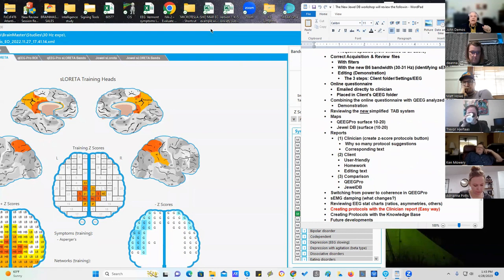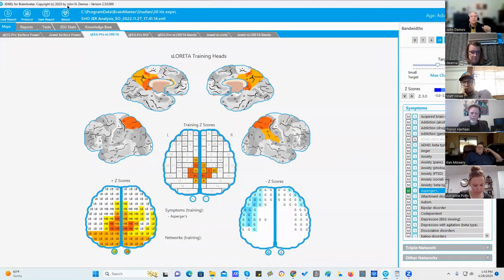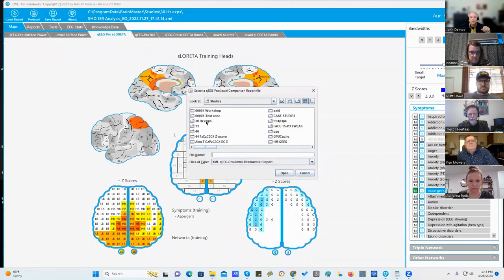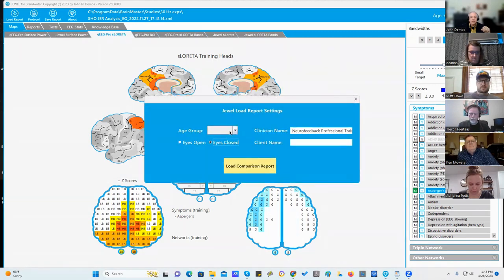Oh, one thing we did not do is on reports. So I loaded a report, and now I'm going to load a comparison report. This one was eyes open that we picked, and now I'm going to pick the same one, eyes closed.